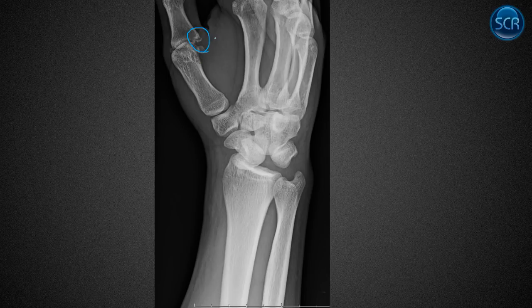And so you want to make sure you're looking for that. The other thing that you'll notice here, if you're going through your carpals, like I told you to, their lunate should be here cupping the capitate, shouldn't it? And it's not. It's tipped out here. So this is a lunate dislocation with a gamekeeper's thumb. So this would be a great case for testing you on boards or something, because you have 2 findings to make. But both of these are going to be managed similarly. You need to go to ortho. This one's not really that displaced, so they probably will just put a thumb cast on this one, but this requires surgical reduction.